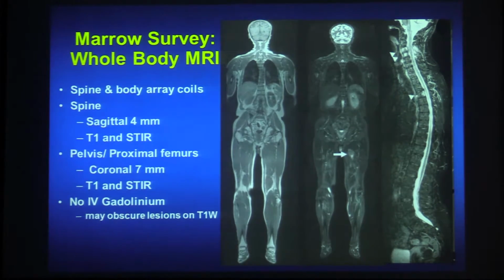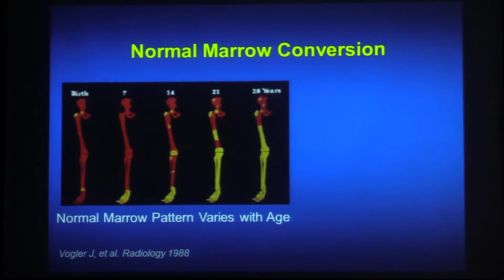In an academic imaging center, academic radiology department, we musculoskeletal folks look at the brain tissue and say, hey, wait a minute, we don't want to see that at all. And the body imagers look at the MSK stuff and don't want that at all. So it's not that we do a lot of this, but people have demonstrated this as a technique, and some locations are doing it to see sort of a whole body analysis of marrow abnormalities.